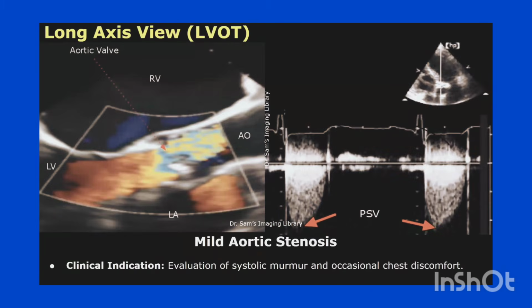Here is a case of mild aortic stenosis. Clinical indication is evaluation of systolic murmur and occasional chest discomfort.